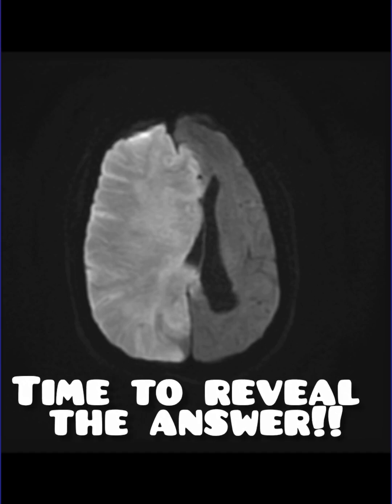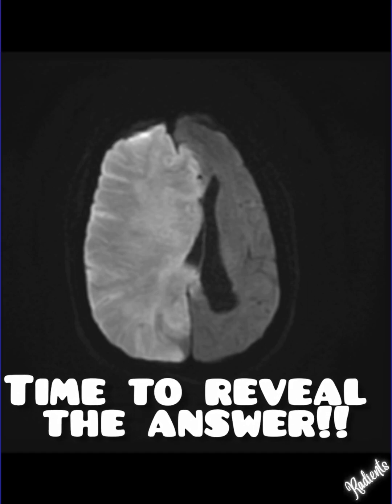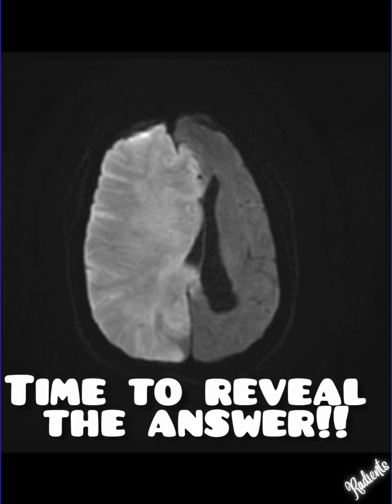Hello everyone. In the previous post, we had asked you a question, and that was to diagnose this particular case. So let's have a look at it on DICOM.